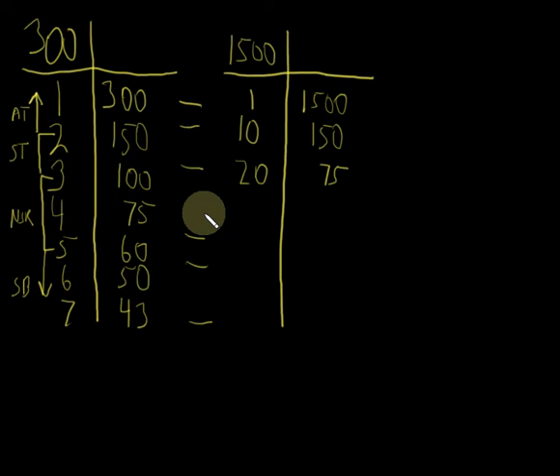And the nice thing is that 6-second rule that I taught you in the last video works for all of this stuff. It doesn't matter so much if it's regular or irregular because over 6 seconds we've got a pretty good sampling, and the odds are that that's going to hopefully remain relatively consistent throughout. But these are 2 ways that you can determine an approximate heart rate. 300 divided by the number of large blocks would get you an approximate heart rate, or 1500 divided by the number of small blocks will equally get you that heart rate.